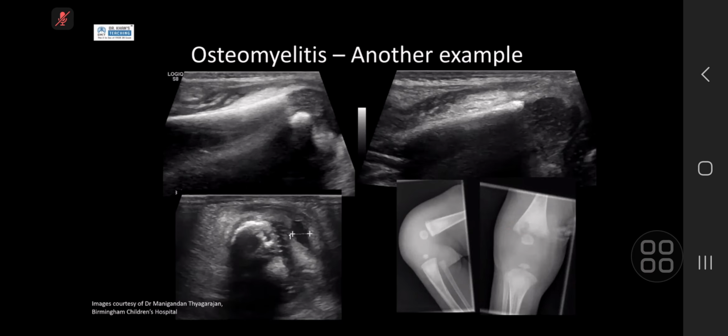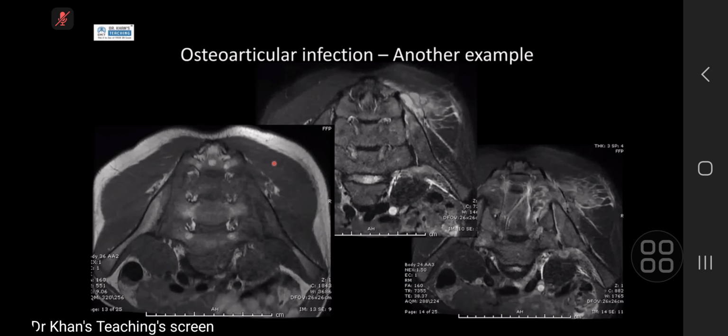Okay. We've got another one. Septic arthritis of the SI joints, very common in kids. Don't ask me why. And what you're looking for is the characteristic sign. So this is T1. You can see that there's a lot of red marrow, so T1 is not really your friend in helping you tell whether there's marrow infiltration. But STIR is quite good. So that's your SI joint here.